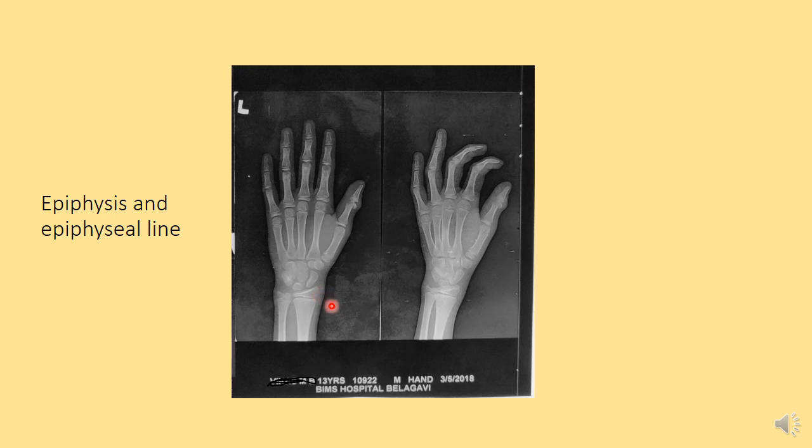In this radiograph, we can see the age is 13 years, where the lower ends of radius and ulna epiphyses are separately seen, which are not fused, which usually fuse at around 14 to 17 years of age. Because of less age, this has not been fused here and here. You can see these are epiphyses. In some x-rays and examinations, you should not get confused with carpal bones.